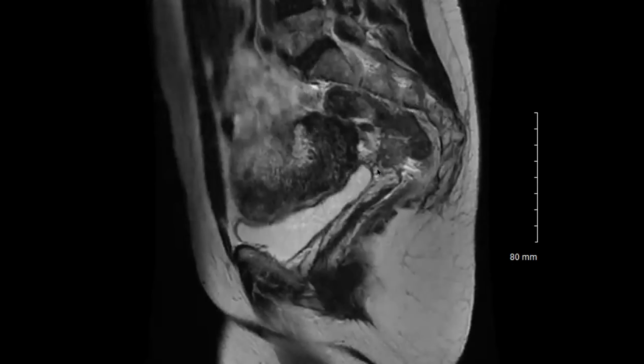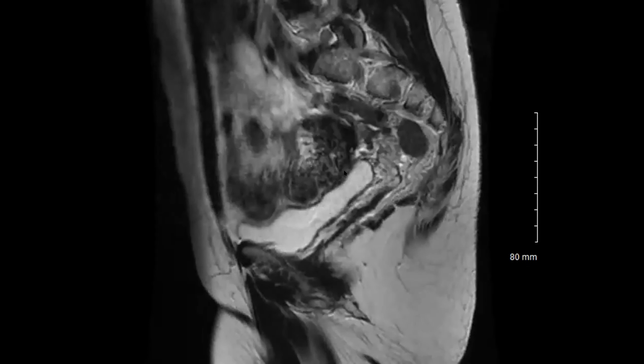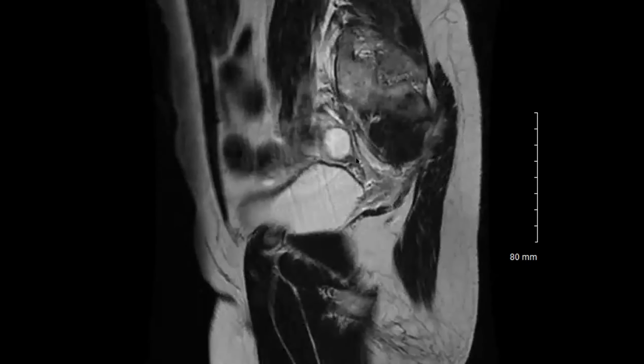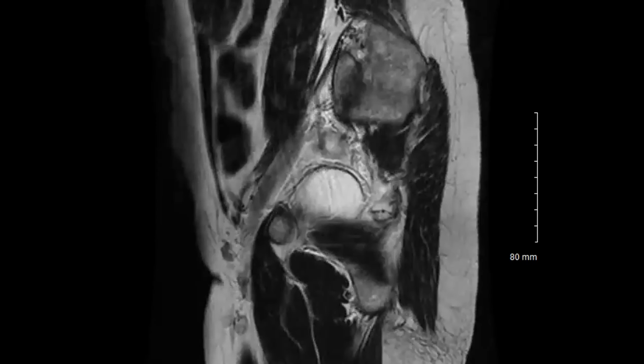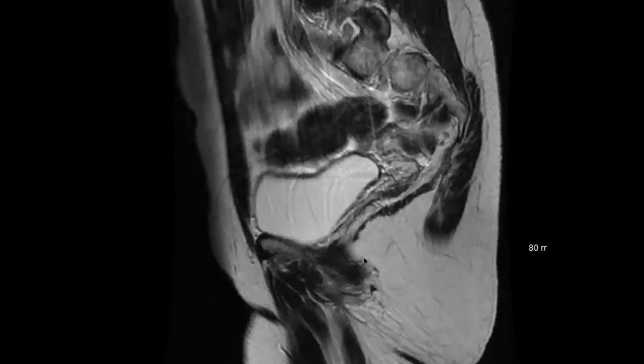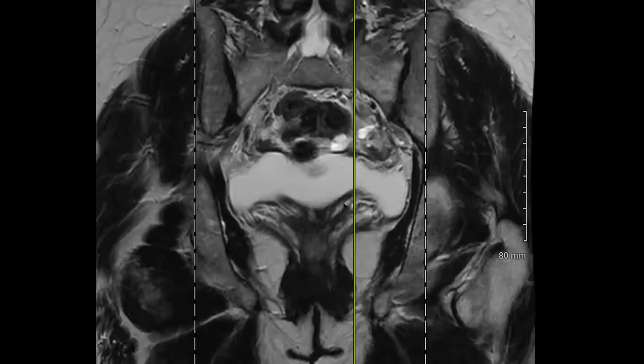There were no adnexal masses, bladder. And then I moved on, didn't particularly notice anything striking. So moved on to... Sorry, there's some kind of T2 irregular thickening. Oh my goodness, Nelly, great eye, excellent. We'll come back to that. So it's just DIE, I think.